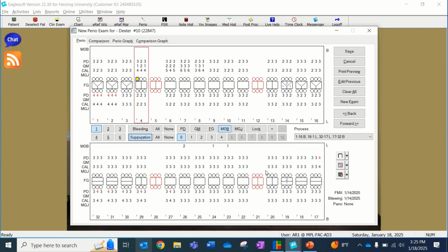At this point, once everything is filled out, this is part of your initial assessment. Make sure that you get these checked by your instructor.